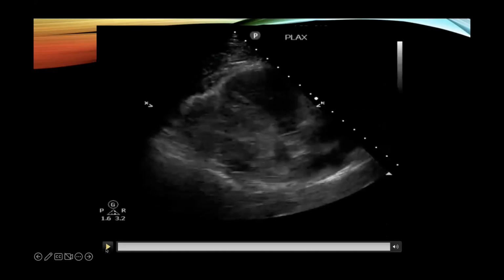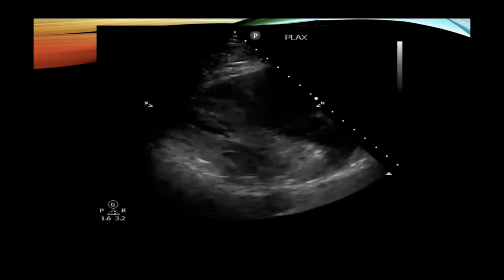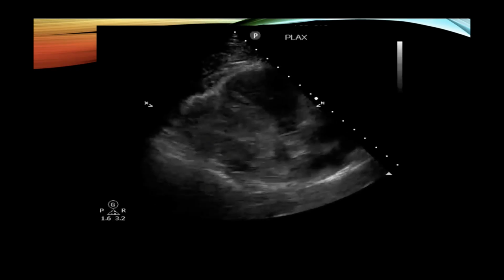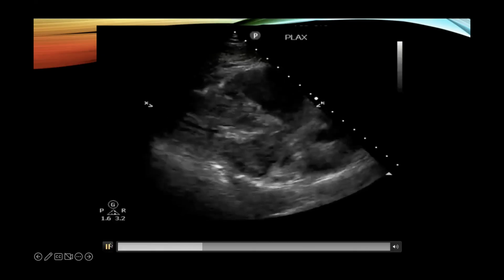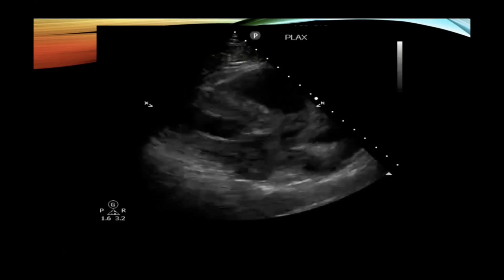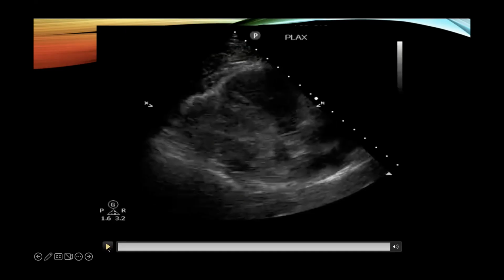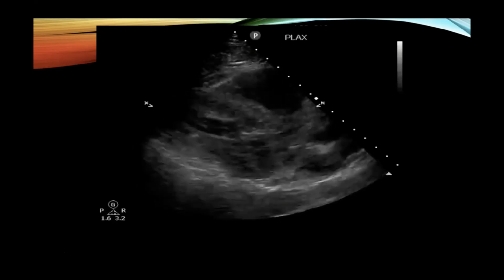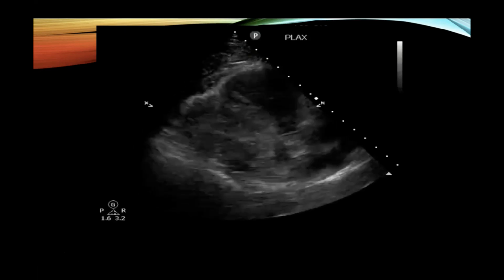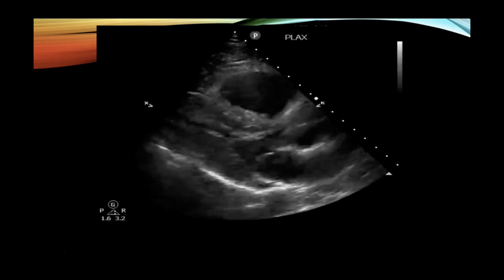So this one, I want you to look at the chambers of the heart and see if they look the right size, if they look big, if they look odd. What do you see on this one? It definitely looks a little bit odd. It looks like the walls are thickened. Okay, what looks odd? Which ventricle or atrium? For the septal wall and the right or left ventricle wall, it looks a lot thicker than normal. What do you think about the right ventricular outflow tract?